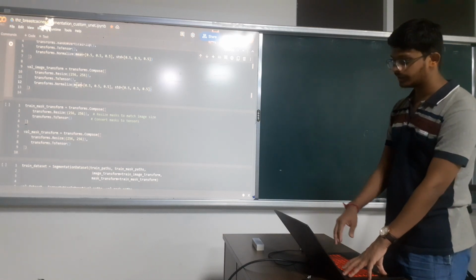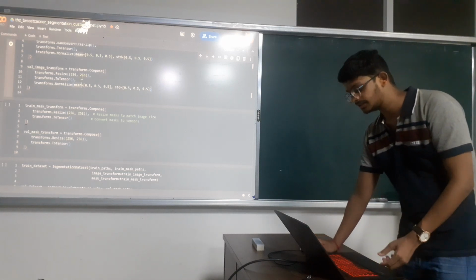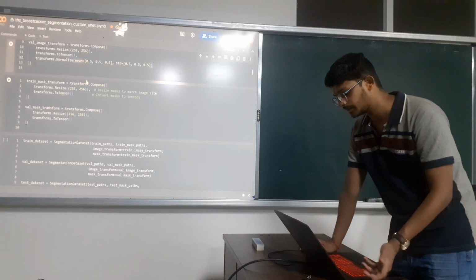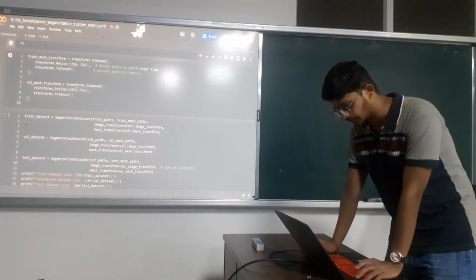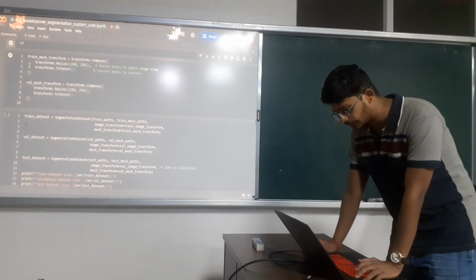And if I provide that with the test dataset itself, it would not be beneficial, since it would already have all the values inside it, and the result will be 100%. So I cannot show it for the test dataset. Same I have done for the train mask transforms.